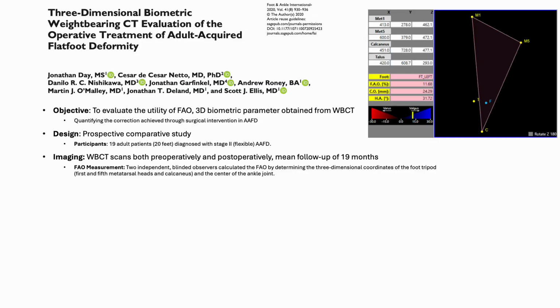I think earlier I had to correct myself. It's not the talus, it's the calcaneus, and that's exactly what we look at with a weight-bearing exam, non-weight-bearing exam. We look at the first metatarsal, fifth metatarsal, and the calcaneus, valgus orientation, forefoot varus. Hey, I got to correct the forefoot varus, so I need to get that first ray down, doing a Cotton, Lapidus procedure, whatever you kind of prefer. And that's how I always describe it. I describe a tripod, and that is the tripod of the foot. That's kind of what it would look like in the computer system.